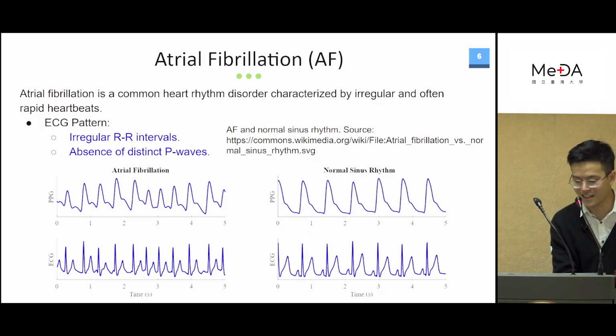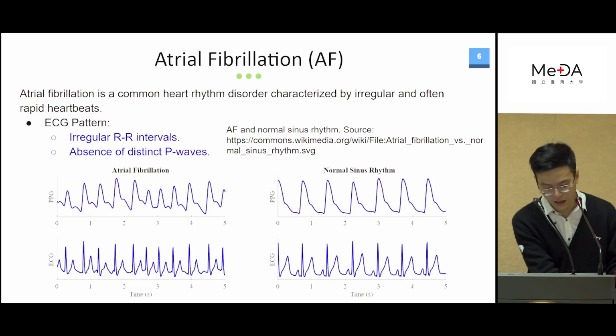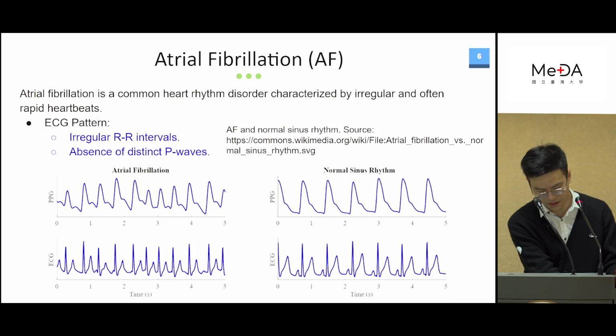For example, in the following images, the right one is the normal ECG. In the bottom right signal, you can see that the RR interval, which is the distance between two consecutive R peaks, is pretty much exactly the same. They're about 0.8 seconds, which is pretty regular.